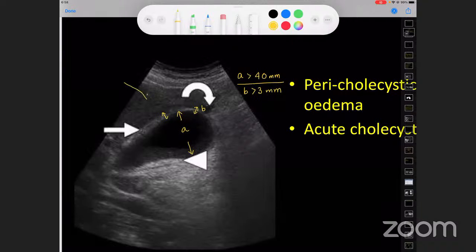And definitely you have the pericholecystic edema. Ultrasonography, you could rate this by the book, but we always rely on the clinical setting. The part of ultrasonography in acute cholecystitis is to see the complications: whether there are multiloculated pericholecystic collections, whether the wall thickening is symmetric or asymmetric, whether there is air inside the gallbladder or gallbladder wall, or any evidence of impending rupture. And the most important thing is the CBD, whether there is any stone slipped into the CBD lumen or not.